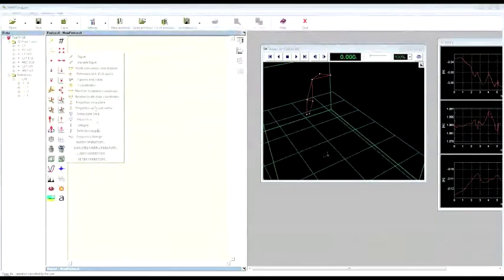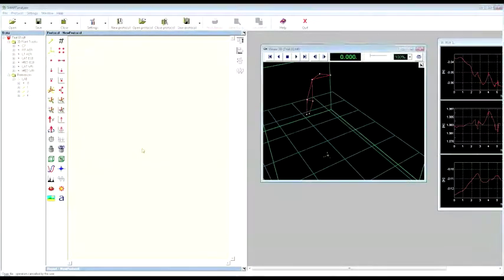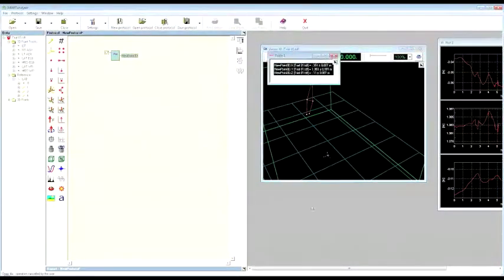So for example, I can choose the mean operator, and I can click on temporal mean. As you can see from here, each operator has one or more inputs and has just one output. To get an output, you have just to drag and drop the required input into the operator. And as you can see, the related dot becomes red, as it is in this case, that means that the chosen variable can be used as an input for the operator. And so you can see the output.